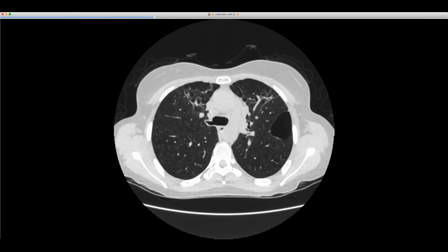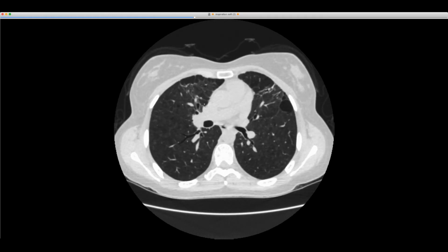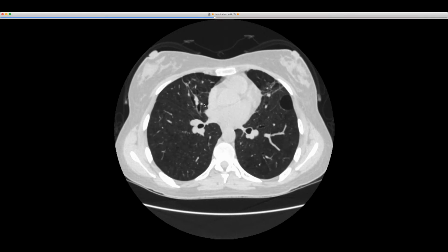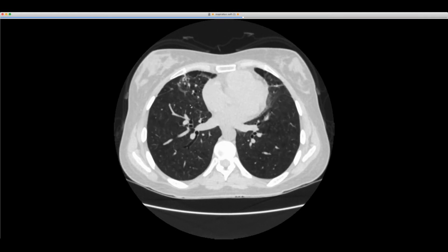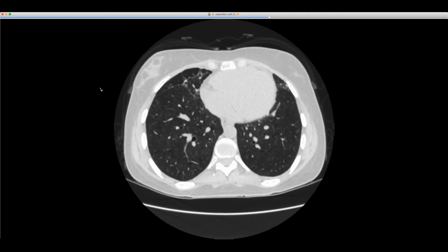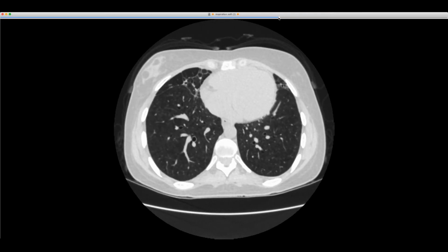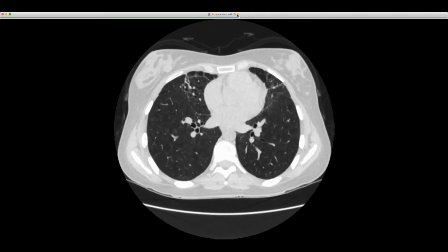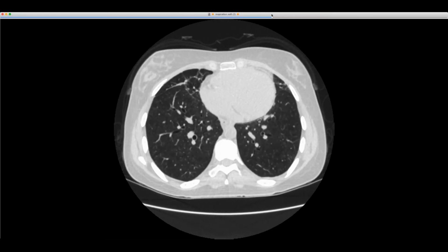So this just came through yesterday, I think, and this is a patient, history withheld, who has this architectural distortion, some of it's varicoid, some of it's cylindrical bronchiectasis, has some traction, looks like almost a tethered appearance. The fissures are both very anterior predominant bronchiectasis and fibrosis pattern. And you can see that. Next question is, are there any tree-in-bud nodules? There are no tree-in-bud nodules.